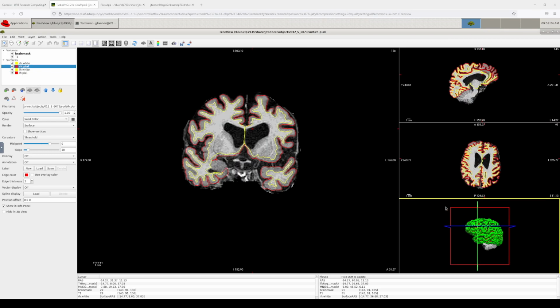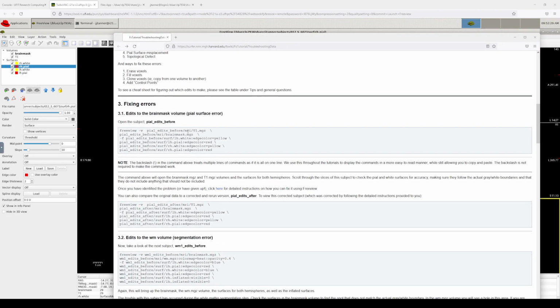Okay, I had paused the recording while it was loading, and I changed the view to be the coronal view over here. You can do whichever view you prefer, but again, I might pause and then jump back depending on the internet speed for me. What I'm going to show you here is, I've now opened something like this. This is a different participant, different subject, but now we have that open.